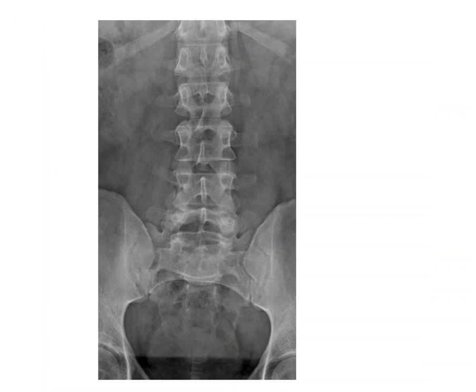All right, let's look at the anatomy of the AP lumbar spine and talk about how that anatomy ties in with critiquing our images to know that we have positioned it properly and that we have a diagnostic image to send. So what we're looking at is the AP lumbar spine here. The patient lies flat on the table with their knees bent, their hips tucked. Central ray with a large collimated field.